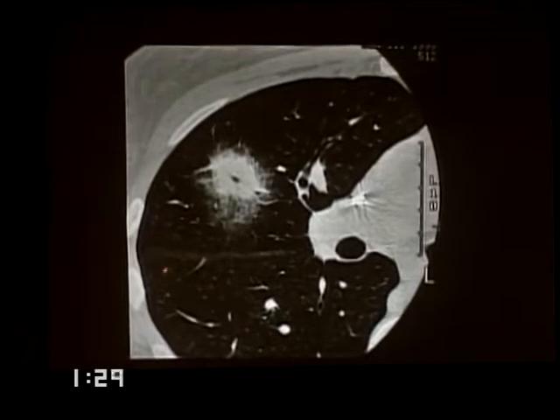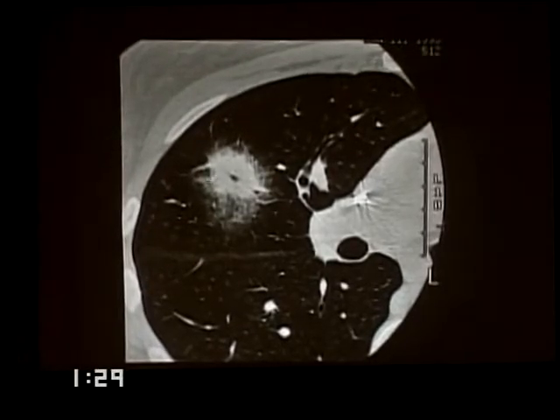fungi. This is the classic manifestation of Aspergillus in an immunologically deficient individual. The classic central, very opaque infarct with surrounding hemorrhage in the alveolar unit. These are much smaller, much less distinct nodules. These are Candida. Aspergillus produces infarcts by blocking relatively large pulmonary arterioles, therefore the nodule tends to be relatively large, whereas Candida blocks smaller vessels.